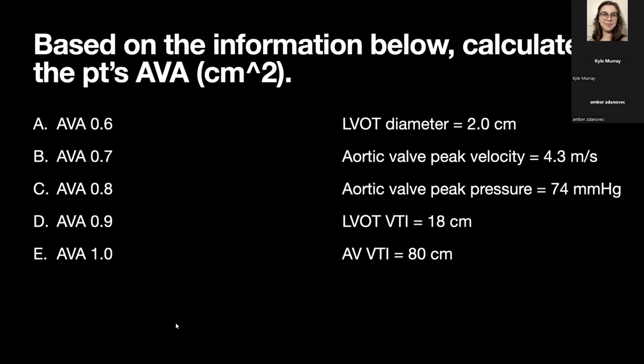This is the worst. If you can get through the aortic valve area, and I'm being a little mean because the computer does calculate it for you a lot of times.